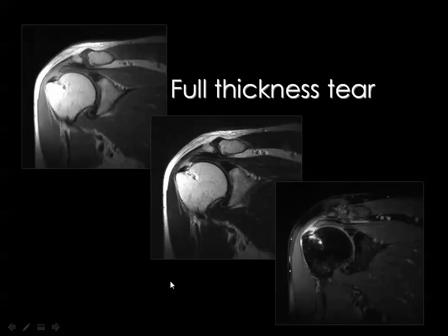Then this is the full thickness tear of the supraspinatus tendon. You see the cut edges, and this is the gap, which may be in the range of a few millimeters. Then you look for the muscle, and the muscle is good because the muscle bulk is maintained, and you cannot see the linear high signal fat within the muscle.